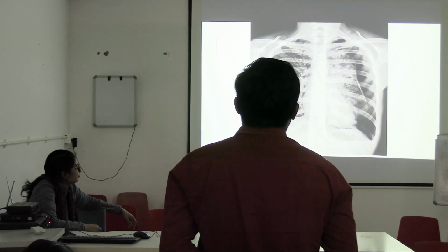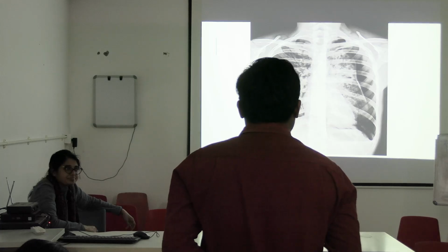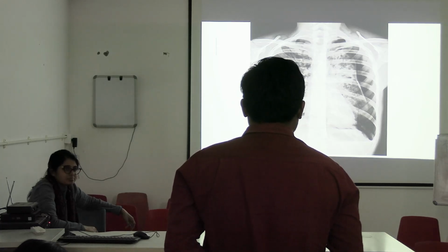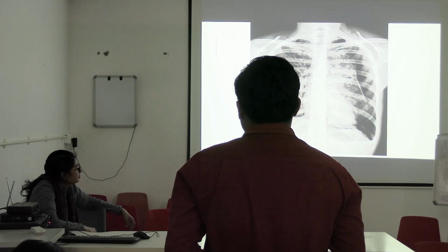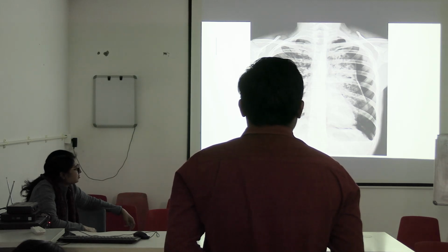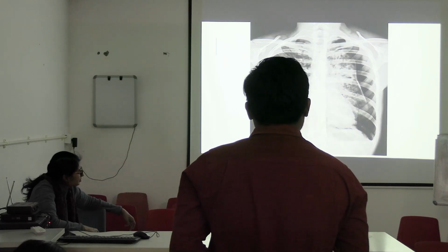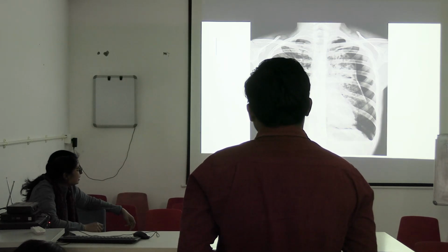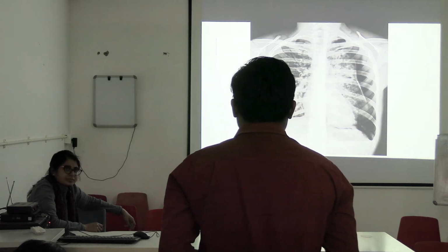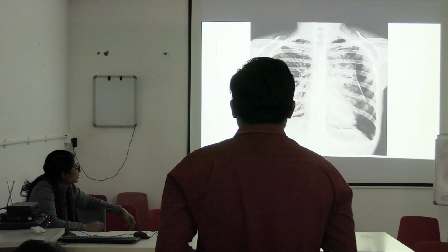তারপর বলো এবারে। Now describe the lung, both lungs, what you can see. How will you describe these areas? On the left side there is hyperlucency around the periphery of the chest, and the lung has collapsed and air is present between the lung and the rib cage. Acha, right side? Right side there is also some amount of air present in the costophrenic angle.